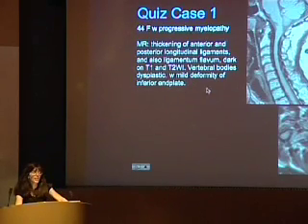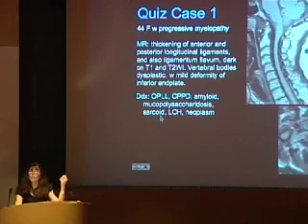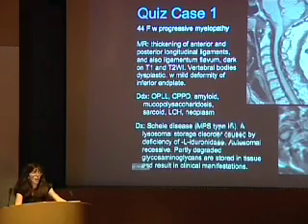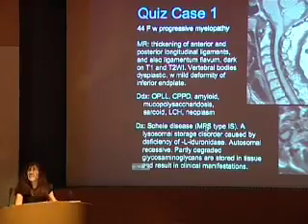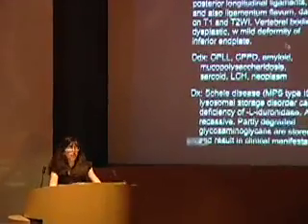Okay, so we've got all this thickening, but we also do have this little bit of funkiness of the vertebral bodies. All right, so the differential: OPLL, CPPD, amyloid, mucopolysaccharidosis deposition, right? Sarcoidosis maybe, with deposition of non-caseating granulomas. Langerhans cell histiocytosis. I've seen this cause marked dural thickening, although I've never seen it cause an appearance like this. Some funky neoplasm, it really doesn't look neoplastic. And this patient actually turned out to have mucopolysaccharidosis. It's not the point that that's the diagnosis. The point is just to think about the differential, and that was just for fun.